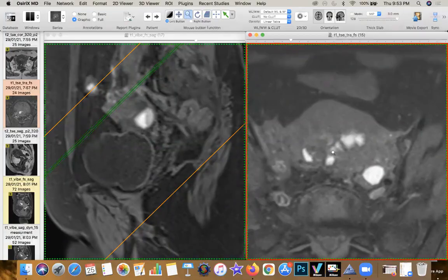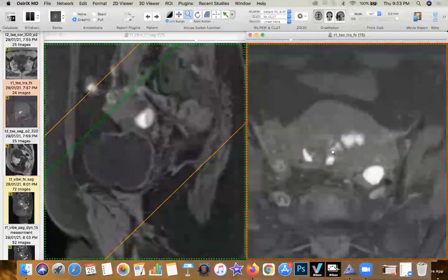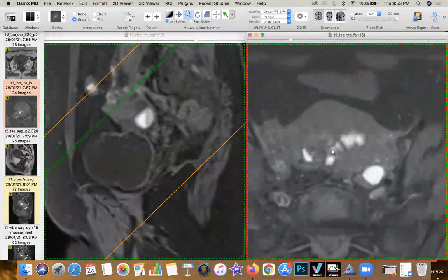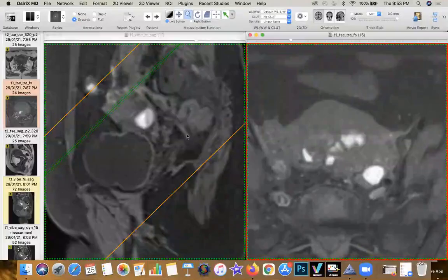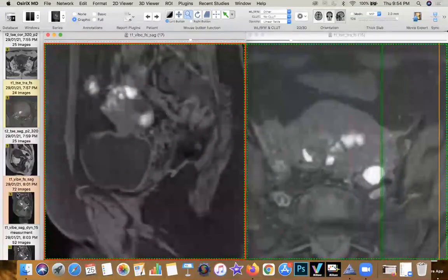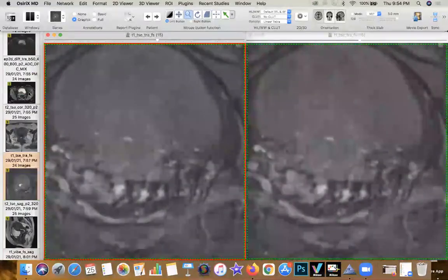So the first case was a classic deep or mid cul-de-sac peritoneal endometriosis, as the endometriotic tissue had come out from the fallopian tubes, the typical route of migration of endometriotic tissue. This is a classic case of uteroperitoneal dissemination secondary to an iatrogenic implantation of endometrial tissue along the surgical tract, reaching up to the serosal surface, and therefore now coating the corpus and also the ovaries themselves. So please remember, the gamut of changes can be pretty much mind-boggling when you're looking at these conditions.